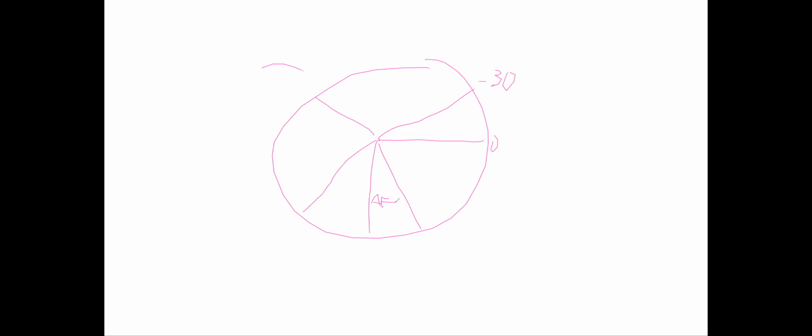AVF, sorry. It's a bit of lagging. You don't need to write it, we can follow you. This side, I don't see the PDF though, so I'm just trying to remember. I can tell you that first of all, you are on the left side, and AVR was a little bit more positive. So then it's probably here, and how much is that one? About -40, 45.